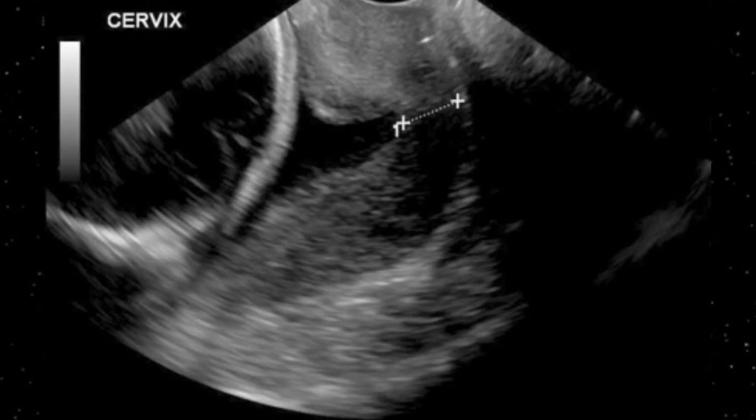Another important point you can pick on this slide as well is cervical length. The cervical length is very shortened, I think it is up to 2 centimeters. The normal criterion is 4 centimeters, it should have been more than 4 centimeters, but here in this case it is less than 2 centimeters or up to 2 centimeters.